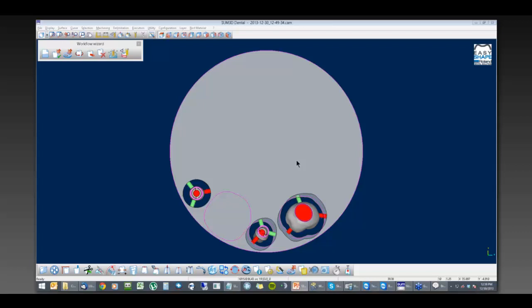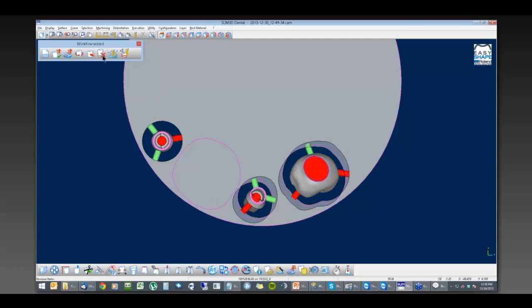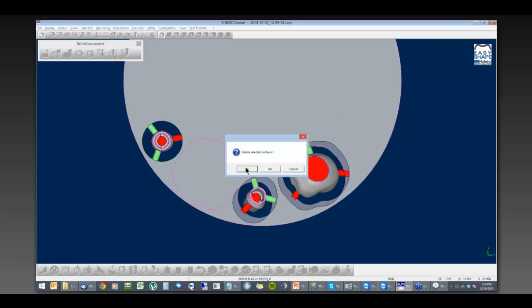Here's a run that I had opened up already. And what I'm going to do here is just simply show you how I could traditionally click to remove items. So click on our remove items, and I can go through here and individually click each one of these connectors, especially on these abutments. Usually the auto placement on the abutments is a little bit off, so you're going to normally want to place your own support pins anyway. But I can select all of those and just right click on my mouse and say yes to get rid of those.